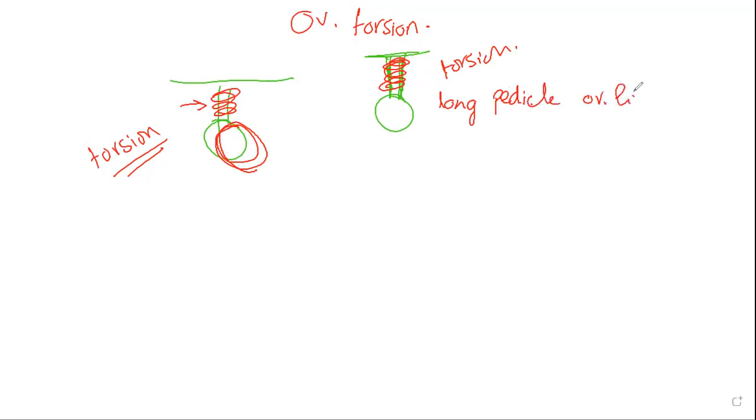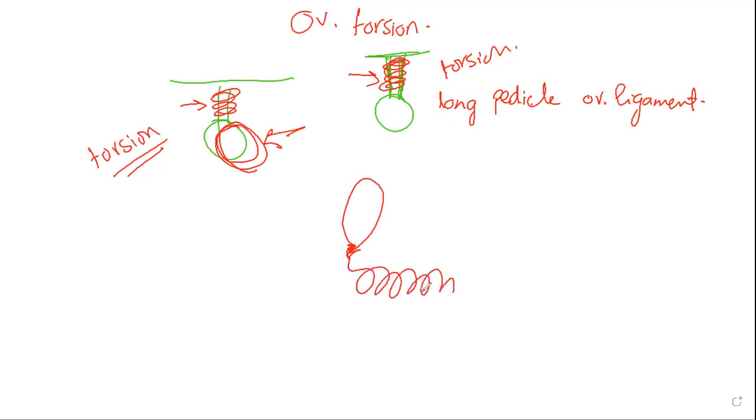This is important because do not exclude torsion when the ovary does not have a cyst, when you have other reasons to believe that this is torsion. So when does the torsion happen? When there is a big lesion as such, or there is a long ovarian ligament as such that makes it wind around itself, just like the birthday balloons that twirl around.